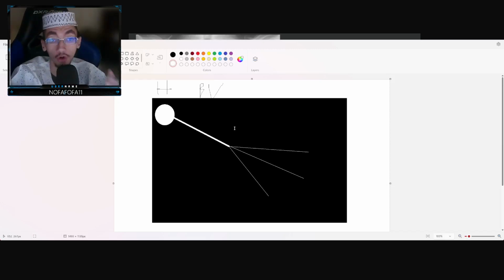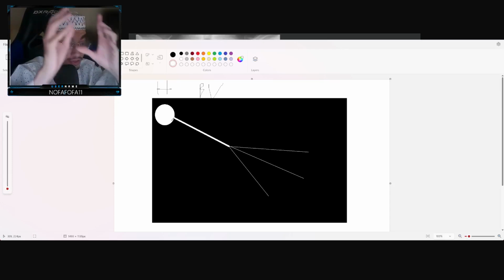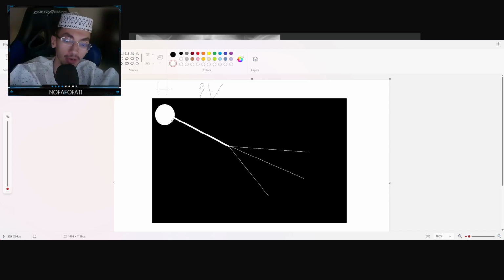Now, this is what a lung interstitium normally looks like, in which you have pulmonary blood vessels being very visible in the center. Then they spread out towards the periphery, and when they do, they become less visible. And with each pulmonary blood vessel, there is an alveoli, which is black.